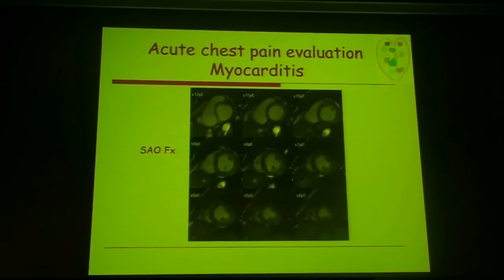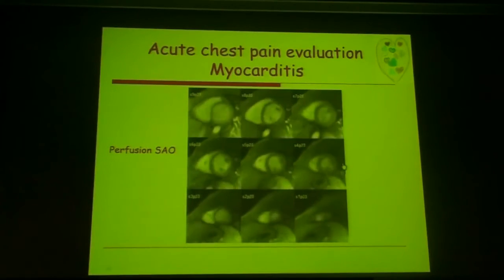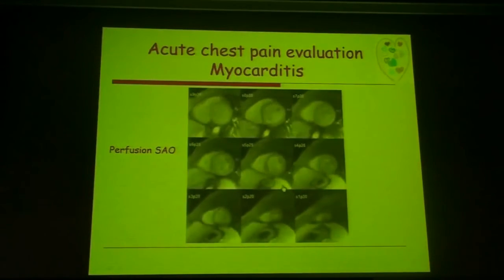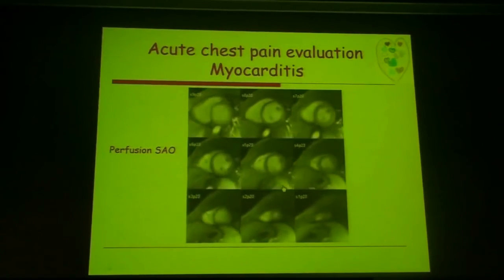As we can see very nicely, the ejection fraction itself of the left ventricle, of course, as demonstrated previously, we can calculate it, and we calculate it for each case. We can see visually that it's normal, as well as the function of the right ventricle. As we're continuing to the perfusion images, we're looking at the gadolinium as it enters the right ventricle, the left ventricle, and the enhancement of the myocardium, and we're not seeing any perfusion defects. So no perfusion defects. There is evidence of edema, and we do see hypokinesis in the lateral wall.